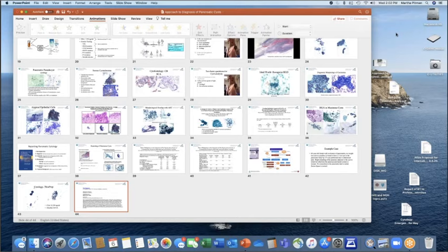But they have a brush border, right? And goblet cells, which do have mucin in the cytoplasm, are punctuated throughout, and then you can have little intraepithelial lymphocytes scattered throughout. So if you see those types of cells, that's duodenal contamination.